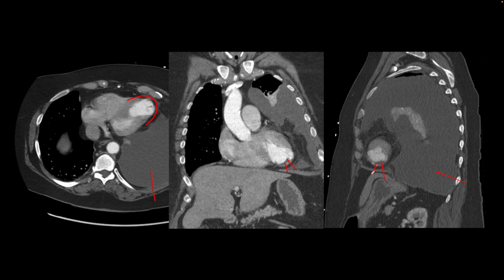So this patient has had prior myocardial infarction. As a result of that, the myocardium has thinned out and become an apical aneurysm, and on top of that, there is apical mural thrombus. So this is clotted blood that is attached to the apex because of stasis in this region, and this can lead to embolism, infarcts, and arterial vascular occlusions, things like that.